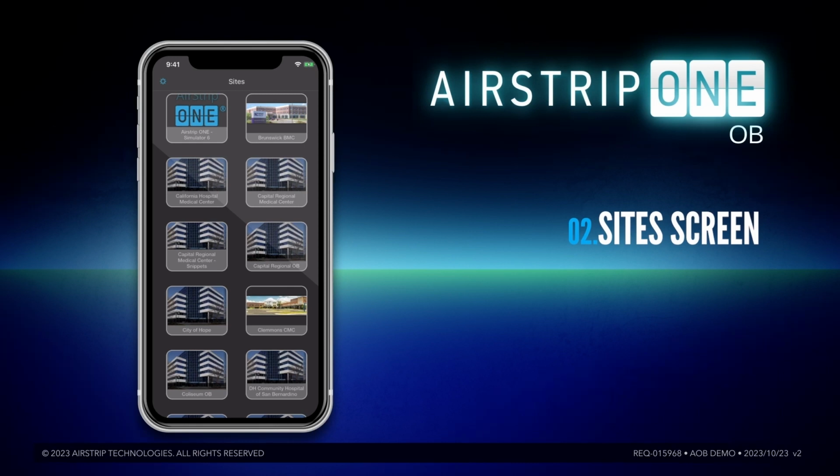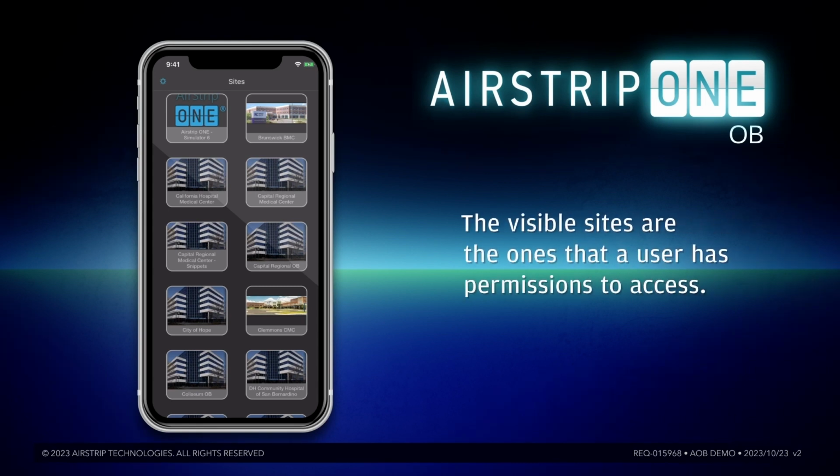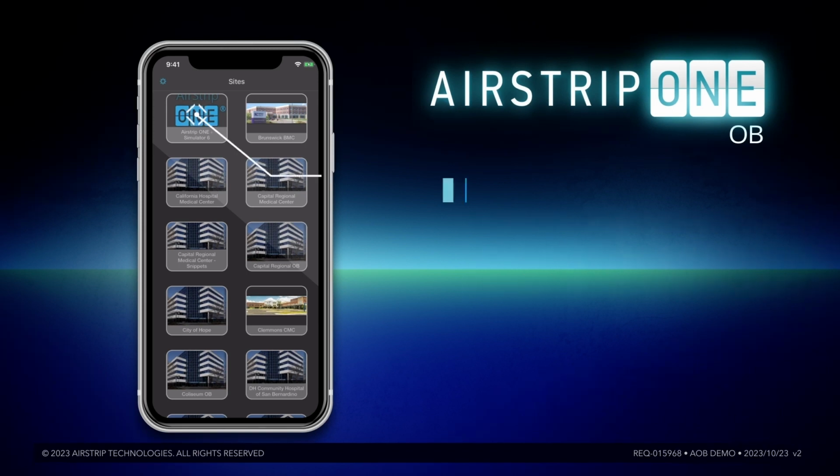This screen consists of all the sites available to the user. These sites are configured in the AirStrip management portal. Most clinicians will have only a few sites listed. For this demonstration, we will be using a hospital with only simulated patient data.